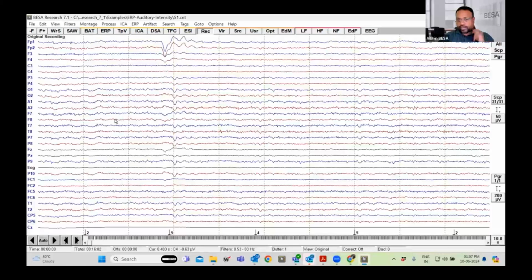So typically when you start from the basics, these would be the frequency filters which are available. Next, what I wanted to show you was on the right side panel, you have this time base, which is 10 seconds per page. Normally, if you are a clinical person, you might want 30 millimeter per second, which is calibrated and which the clinicians have been using for quite a long time.